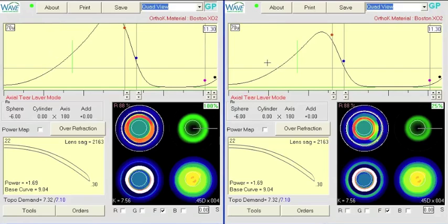So even though we shortened this OZ by almost 1 millimeter, we really didn't do much to change where this tear film surpasses 20 microns in depth. So if the patient did not have any issues with glare or halos before, I generally see that it doesn't become a problem. So I'm not too worried about that.